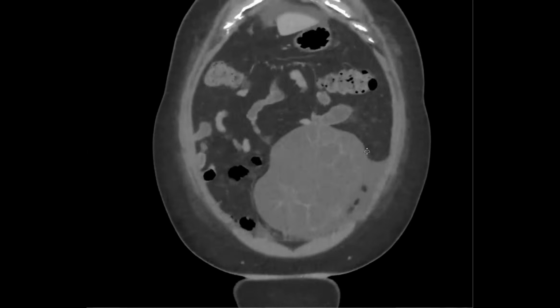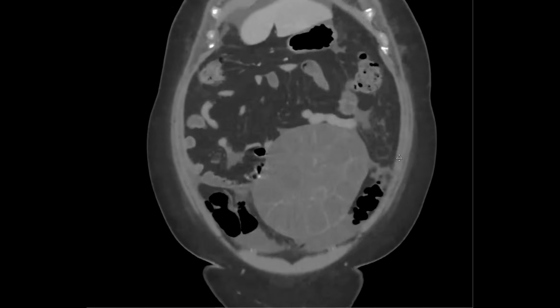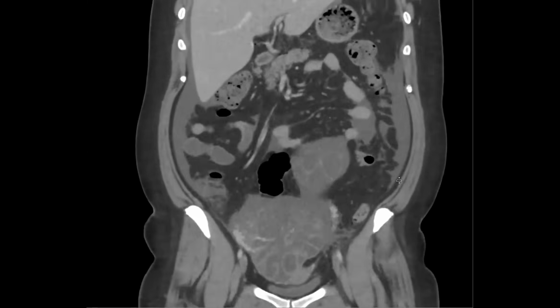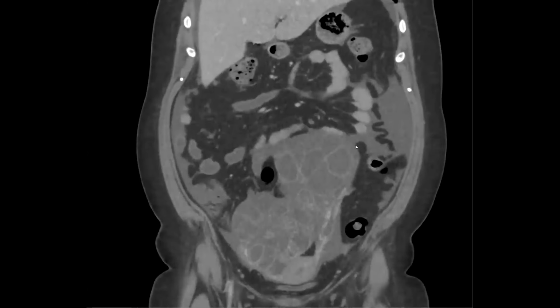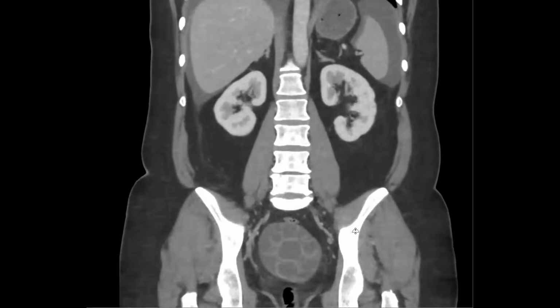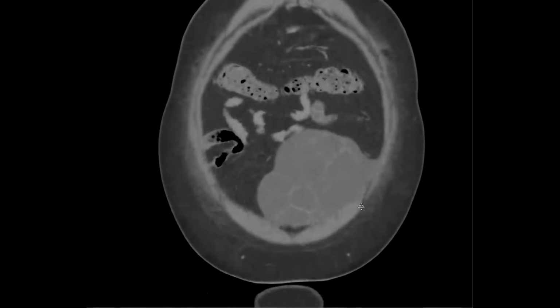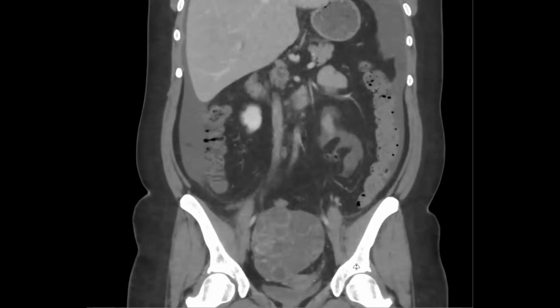So is the fluid just because they perforated the follicle and the fluid came from that, or is it just reactive fluid from the body, due to the ascites here? Oh, I think this is from OHSS, ovarian hyperstimulation syndrome. It causes all this leaky kind of stuff. I don't think it's from perforating these. But yeah, pretty dramatic case.